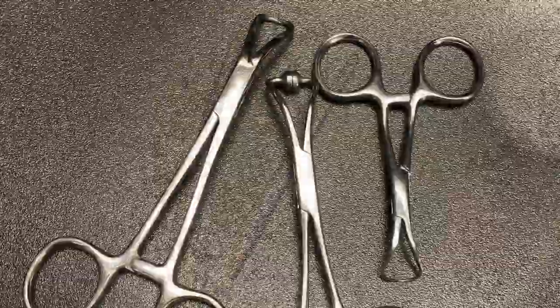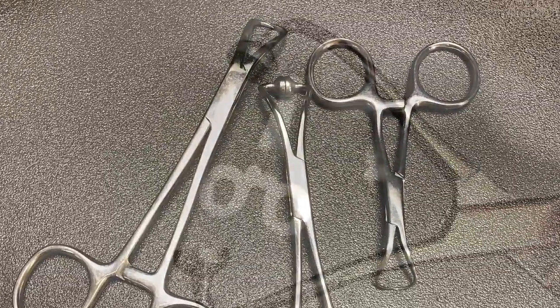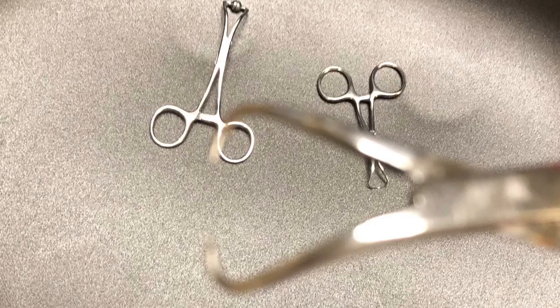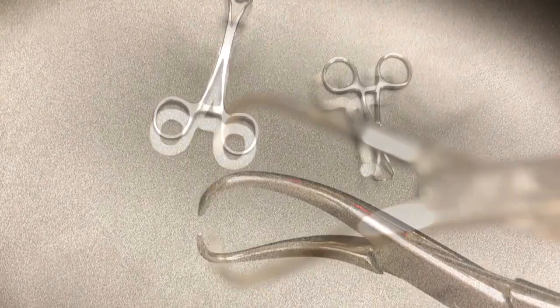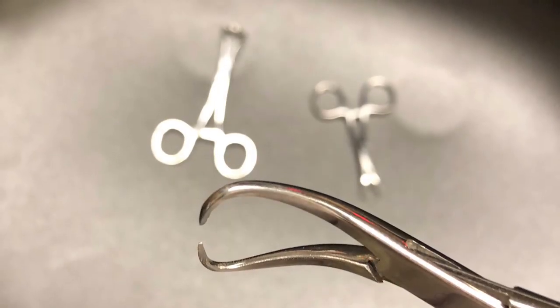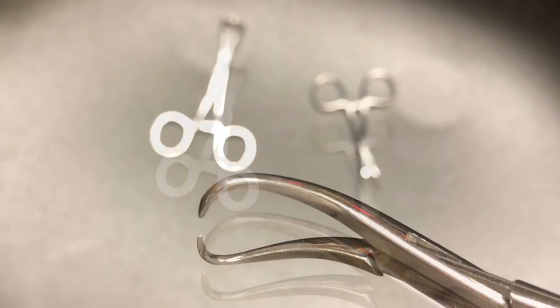Towel clamps, piercing or non-piercing, for clamping towels around sterile surgical sites. Care must be taken not to pierce the skin below or to move pierced towel clips on drapes, as this exposes the field to contamination. Use non-perforating if planning on moving the towel clamp. Some trays only have piercing. You might not have both in your trays.